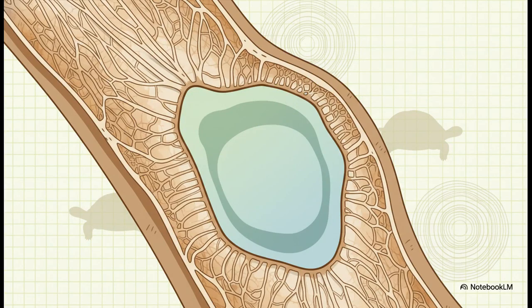First up is the geographic pattern. Think of this as one big, well-defined hole in the bone. Because it's a single contained area of damage, it usually means we're dealing with a slower, less aggressive process. The culprit is taking its time.